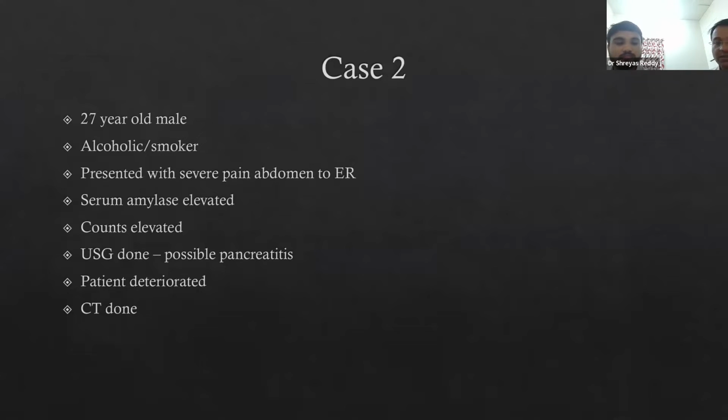What is the imaging performed? Contrast enhanced. What is it called? It's a dual phase. Yeah, dual phase. So be very specific of what you are telling. So it's a pancreatic protocol or a dual phase. Can you go ahead, please see the images and describe the images?